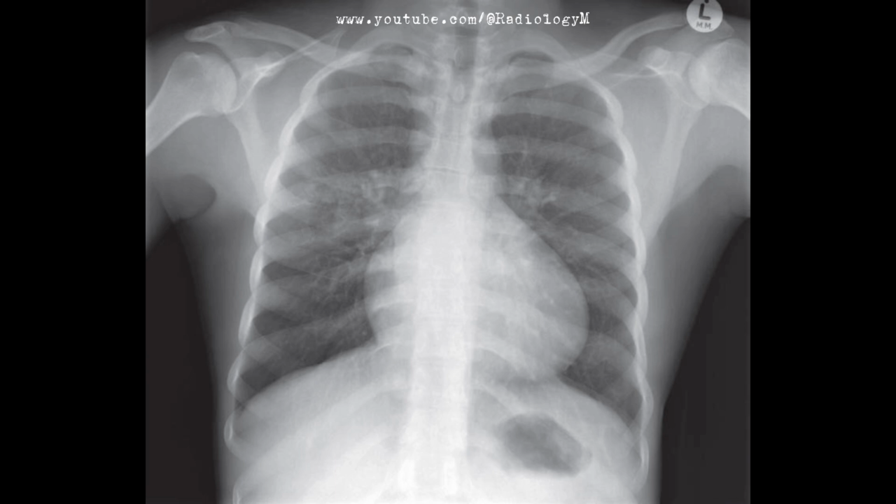However, upon closer inspection, I notice subtle underlying skeletal abnormalities, particularly in the anterior rib ends, which appear widened, and the humeral heads that seem slightly dense with some flattening of the contour of the left humerus. These findings are subtle but could be indicative of underlying chronic conditions such as sickle cell disease.